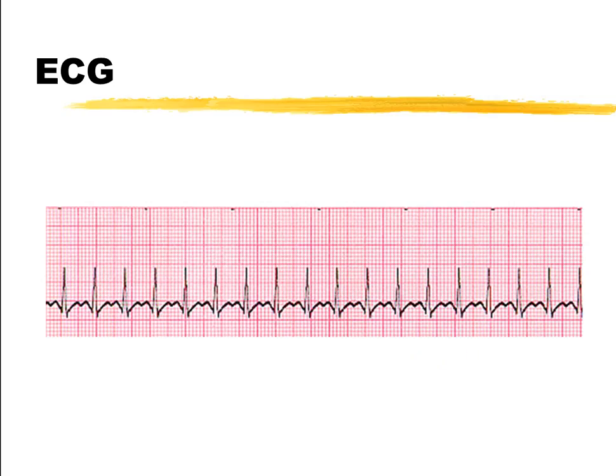Here you can see it looks very similar, and without slowing it down, this could be an example of a sinus tach, where the two waves, the T wave and the P wave, are so close it's kind of bunched up. So these are very hard to determine which one is which. But again, if you count it up, 1, 2, 3, 4, 5, 6, 7, 8, 9, 10, 11, 12, 13, 14, 15, 16, 17, 18, 180, much higher, even though you could have a sinus tach at a higher rate, but these are generally the really fast ones.